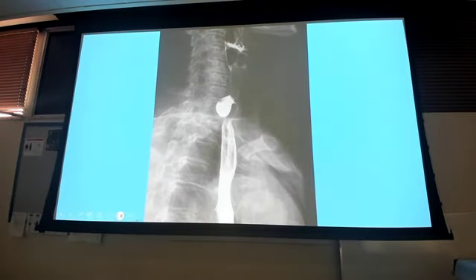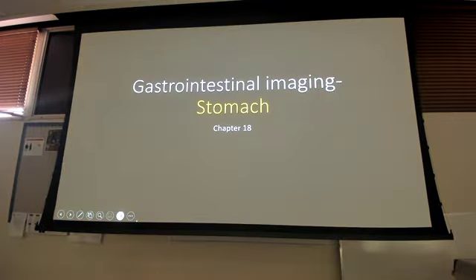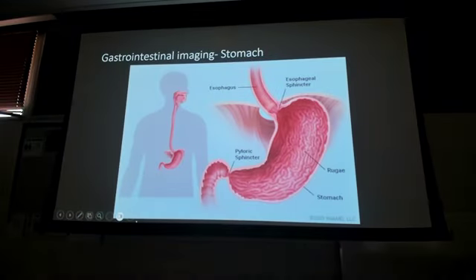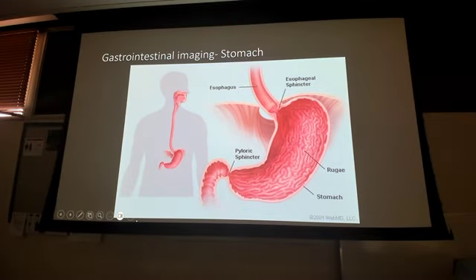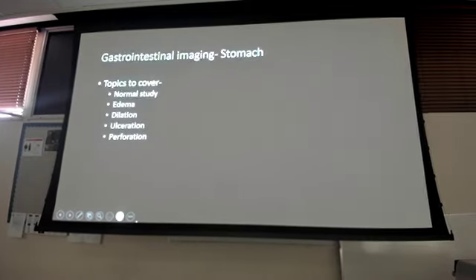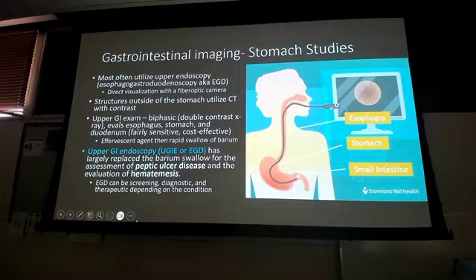What do we call that guy again? Diverticula. All right. Okay, stomach. We're going to look at the same concepts in the stomach. There's the stomach. Same concepts, we're going to look at all the same things. We're looking at edema, dilation, ulceration, and perforation.